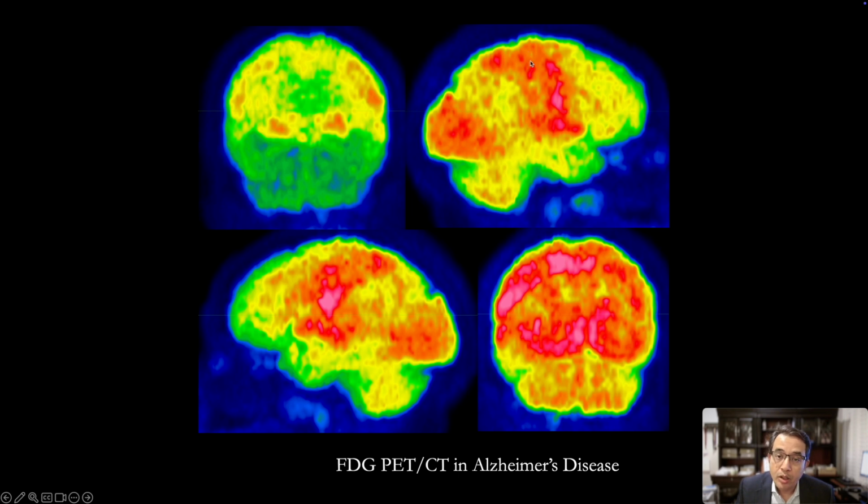On this right lateral projection, we find hypometabolism in the right parietal and temporal lobes, seen right there in a band-like fashion extending from superiorly to inferiorly and anteriorly, and there is preserved uptake in the occipital lobes or the visual cortex, and there is some uptake in the cerebellum. The same thing is seen on the other side.